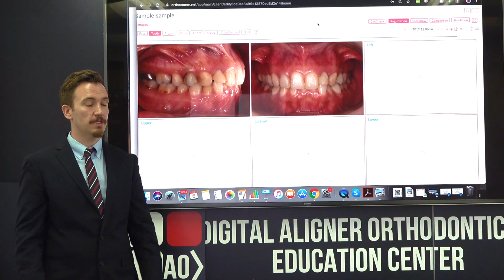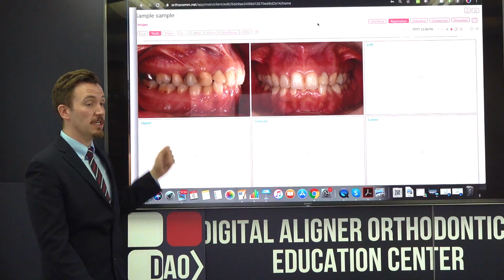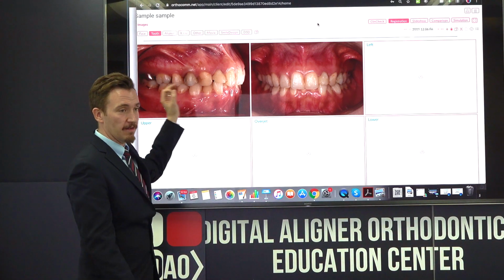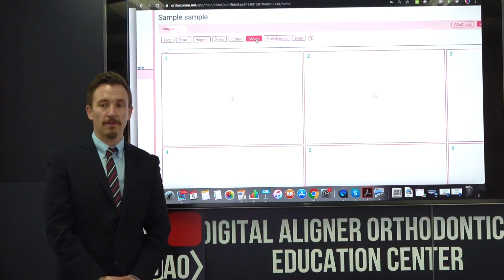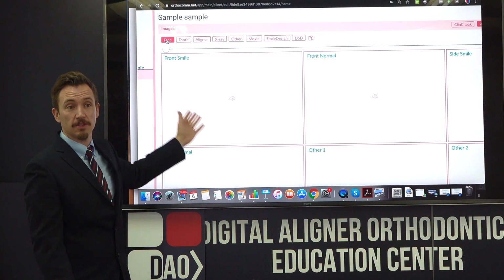So the most realistic situation is that you've taken photos with a camera, you have an SD card, slide your SD card into your PC, open up the folder containing the photographs, either click and drag each individually, or select the 6 that you'd like to upload in bulk, and drop them in. Take pictures with your camera, drop in your SD card, drag and drop. It's that simple.